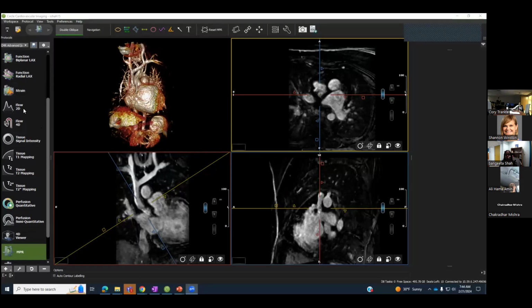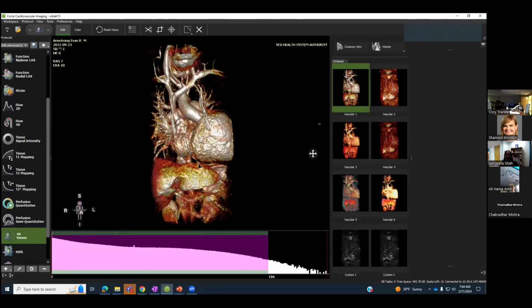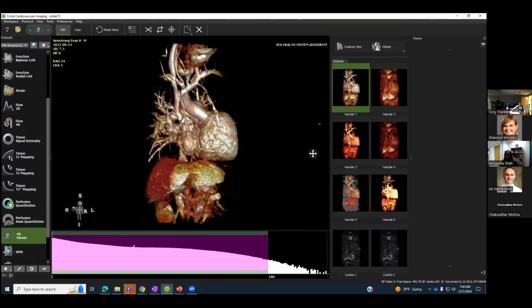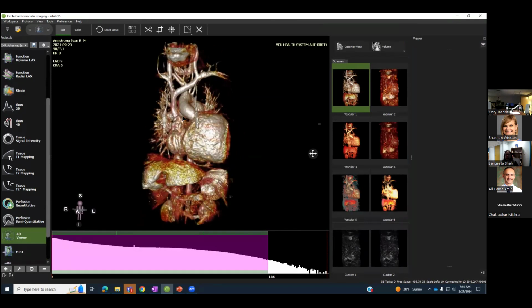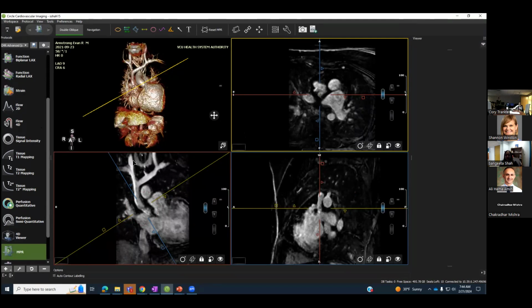All right. So this is the angiogram on this individual. And like I said, it gives us a wealth of information on these individuals. So here's your brachiocephalic vein. Here's your SVC coming through. And I'm going to focus on that. Here's your aorta. And when you look at this, this was done when he was probably about 2 years old.